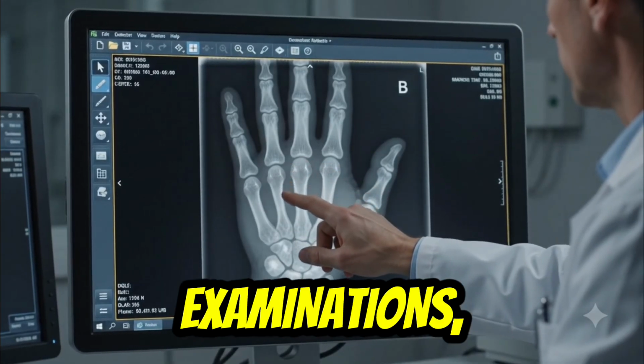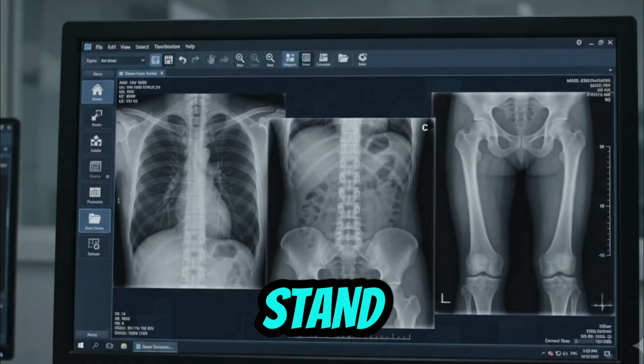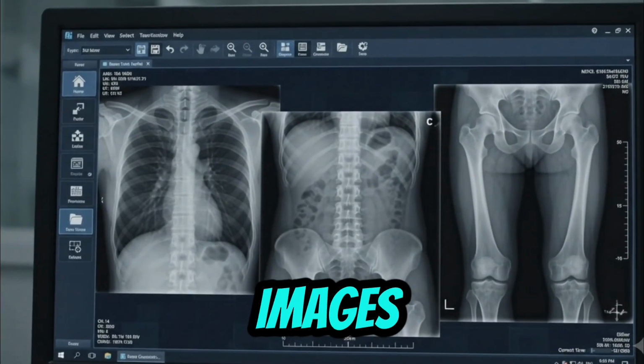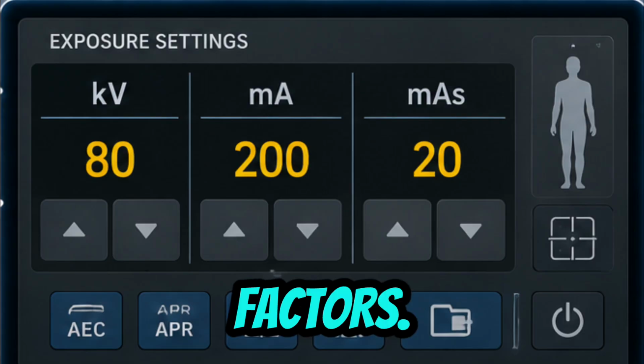For long body examinations, such as full spine or lower limb studies, a stitch stand may be used to combine multiple images into a single long image. Now, let's understand the exposure factors.